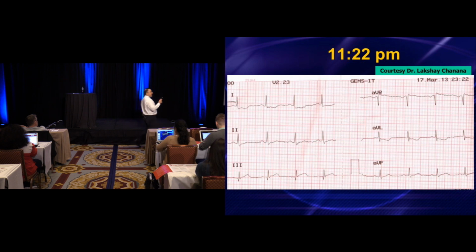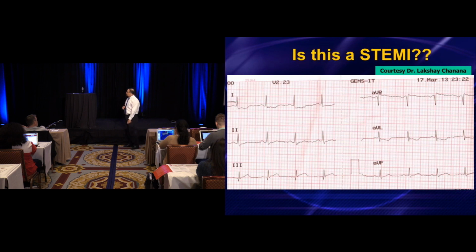So let's say you're working in his shoes, and your decision is, with this patient with a good story, does this ECG meet criteria to give this patient thrombolytics? In other words, is this a STEMI? Now, there's no right or wrong answers here. How many people would take a look at this 12-lead and say, if I'm taking care of this patient, he's getting streptokinase? Raise your hand up.